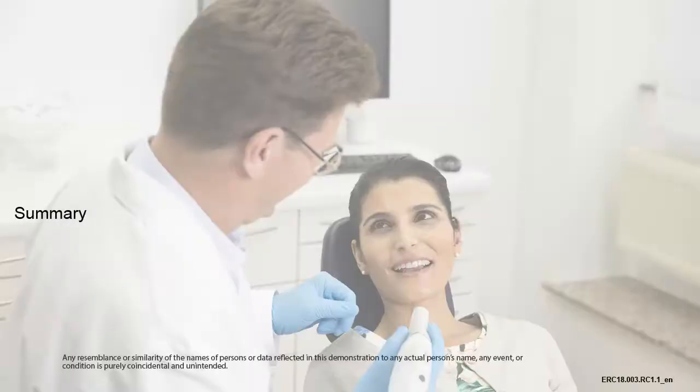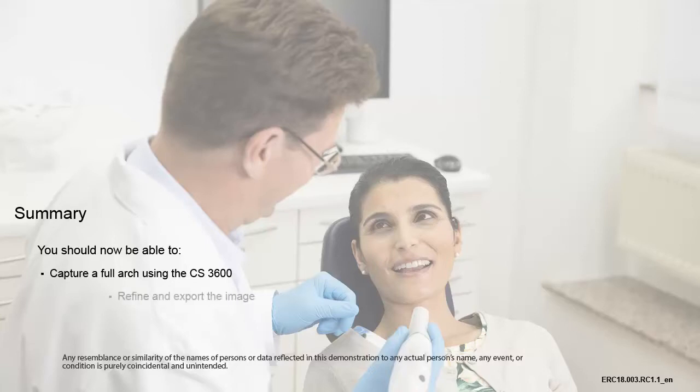This concludes the CS3600 Acquiring a 3D Model for Orthodontics class. You should now be able to capture a full arch using the CS3600 and refine and export the image to the imaging software. If you have any comments or questions about this content, contact us and reference the content code located in the lower right corner of this slide.